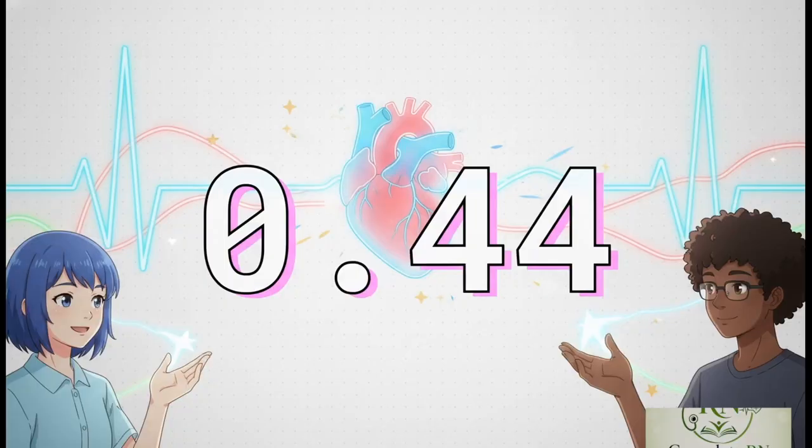And to completely finish out our interval checklist, we've got one more number to look at, the QT interval. Our source value here is 0.44. This is basically the total time it takes for the ventricles to depolarize and then totally reset themselves for the next beat. A measurement of 0.44 is a really solid, healthy repolarization time. And with that value established, boom, we've successfully capped off our clinical methodology. We literally have all the numerical data we need.